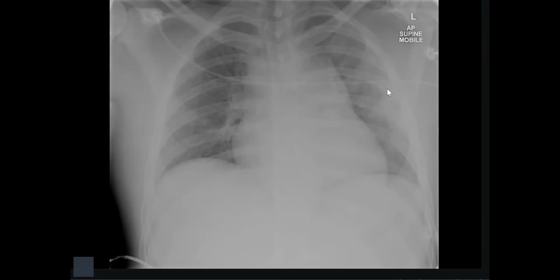Thank you. Okay, my friend, a trauma, motor car accident. What do you see?